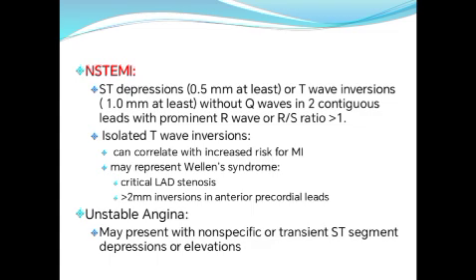Okay, unstable angina. Here we may have non-specific or transient ST segment depression or elevation with negative cardiac enzymes, or it could be a normal ECG in the case of unstable angina.